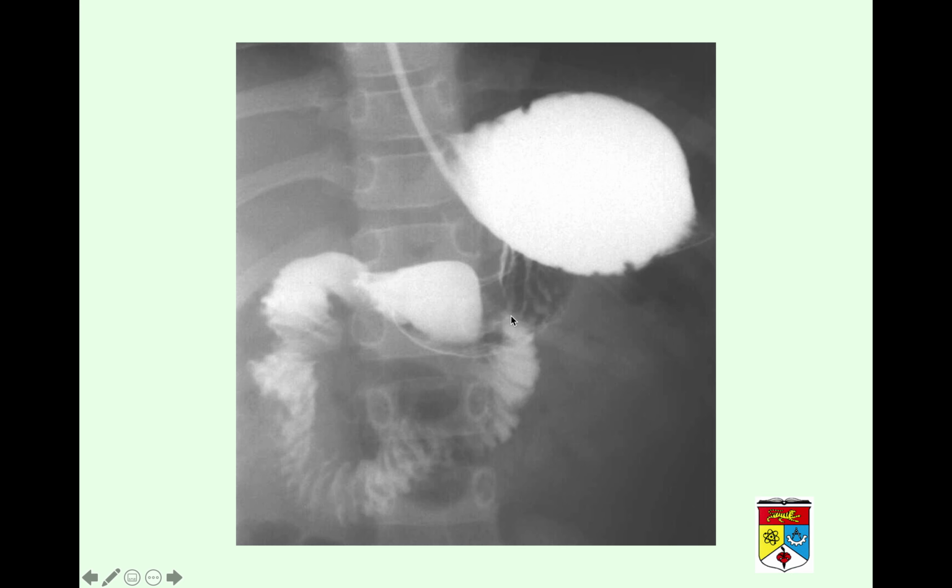Importantly, note that the DJ junction should be at this point, at the level of D1. It should not be here, because this is the normal anatomy, and we know the pancreas is being enveloped at that point. So whenever there's an abnormality to that, it means there is an abnormality related to the rotation of the gut embryologically, and here is where the axis of the superior mesenteric artery is present.